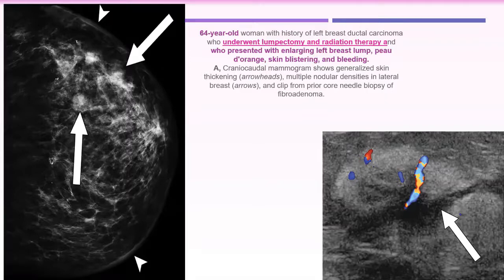I could see debris or echogenicity, so still, I could see echogenic foci, vascular echoes. So yes, vascular echoes, I cannot say this is cystic. I will say low density or hypoechoic lesion, and the borders are indistinct. Yes. Indistinct border.